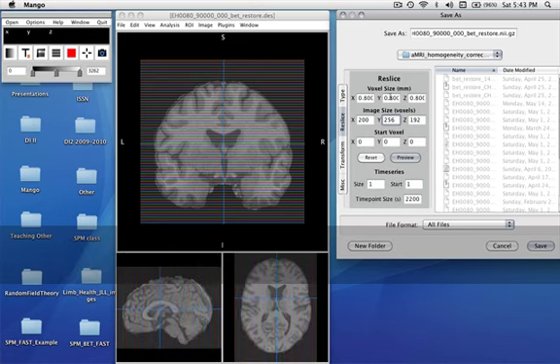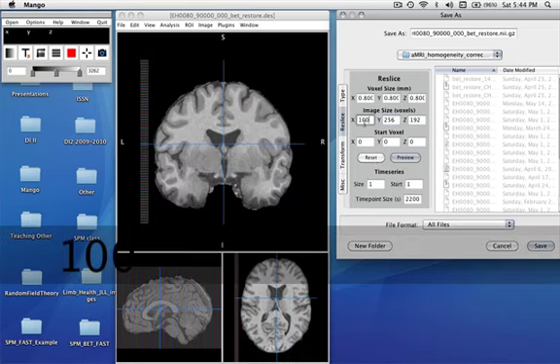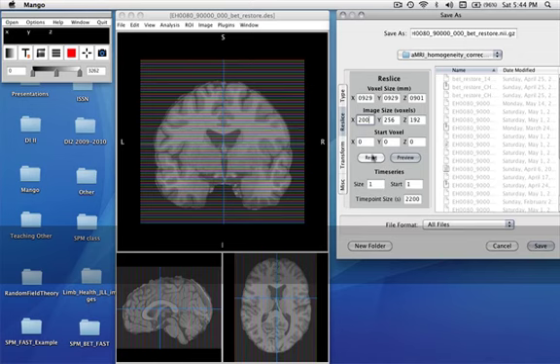But if we change it to something smaller, we'd have to change the offset. And so if we do something we really thought was dumb here, we can just reset it to what it was. So we wouldn't, in this case, since the image array seems to match up the image well, we wouldn't necessarily want to reslice it.